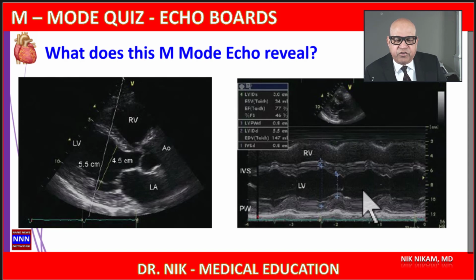That's what we used for decades before we moved on to two-dimensional echocardiogram and Simpson's method of tracing, volumetric measurements, three-dimensional measurements, and all these things. But still, if you get a good image like this from a 2D, extract an M mode, you can get a fairly reasonably accurate measurement of the left ventricular size, thickness, fractional shortening, and ejection fraction.